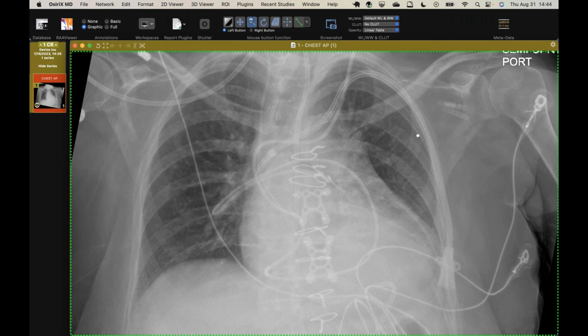But yeah, that catheter is very impressive. So, Jeff, it is indeed a heart transplant patient you're confirming. It is. Yes. Maybe that's the reason for this.